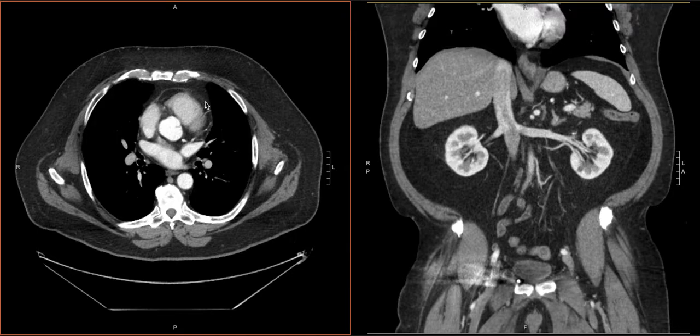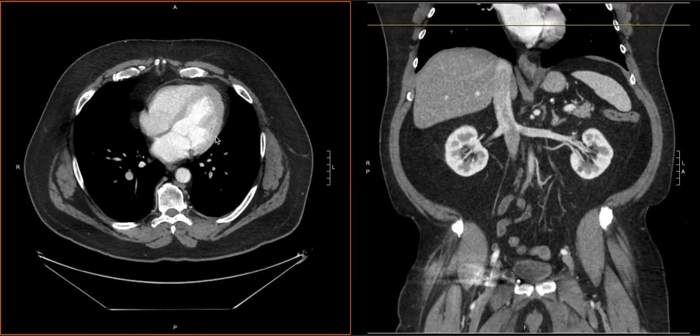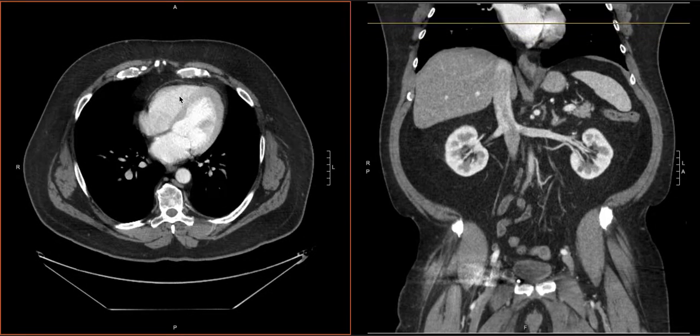When we're doing this part of the search pattern, I like to start with the heart and the mediastinum. We can scroll down and take a look at the heart and appreciate what's going on. So when we look at the heart, we have our right ventricle right here, right atrium, left ventricle, you can see that it's thicker walled, and then we have our left atrium here as well.